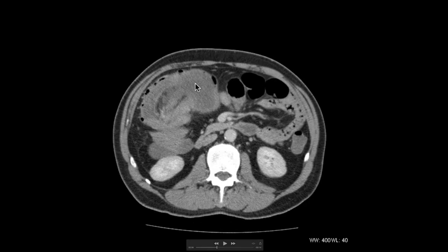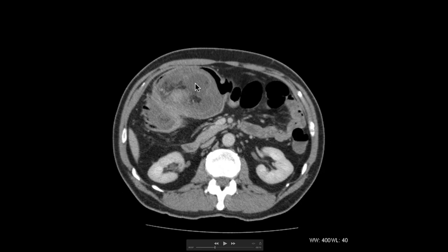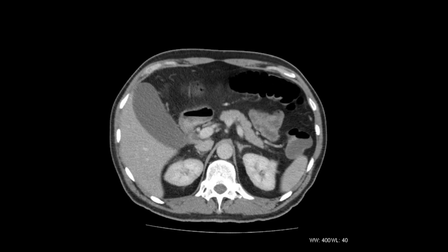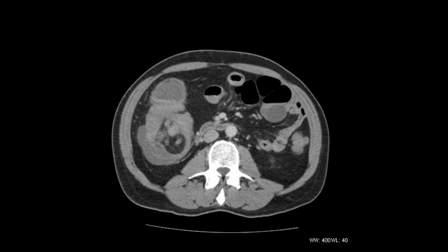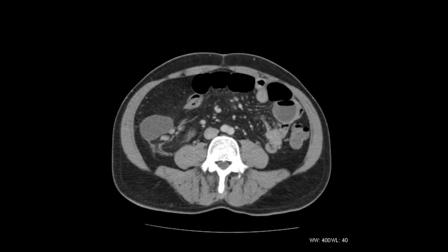But then it's really important to carry on going through the system. There's an expression called satisfaction of search, and it's when you're looking at some radiological test, you see an abnormality and you immediately feel triumphant and switch off because it's like, right, I've spotted what's wrong, I can now relax, my job's done. But actually, particularly for something like this, you need to then look around and see what else is going on.